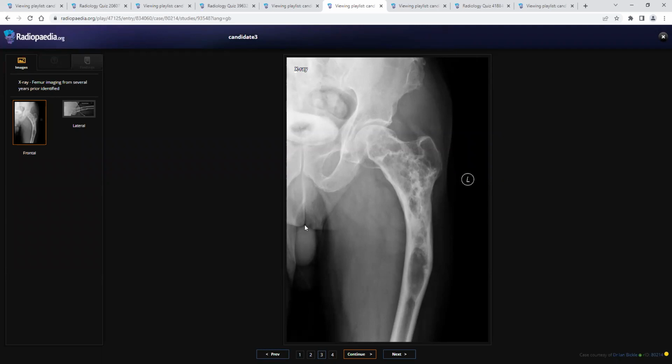and I would like to advise the clinician to correlate with the serum calcium and phosphate levels. And yeah, they were normal. Serum markers were normal, including the alkaline phosphatase. Okay. So in this age group, it could be metastatic disease, but it won't be involving one part of the bone and extending up to the mid diaphysis. There is no history of any primary tumor in the body.